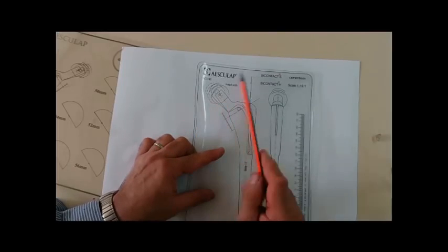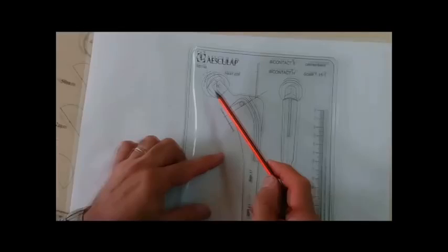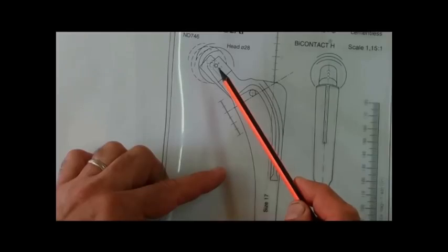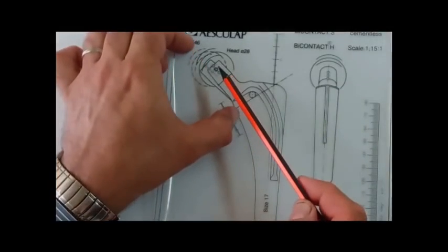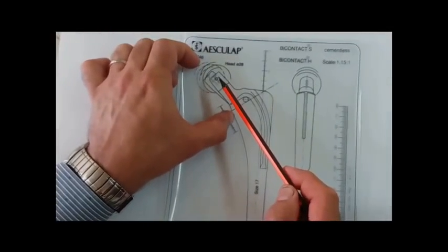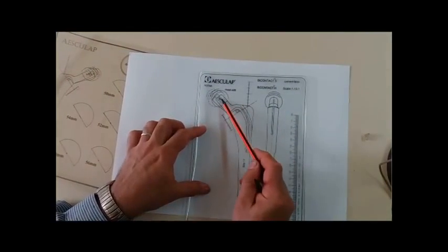This is another issue. The last issue, I think this is clear in the video, is what is called S, M, L. What does this indicate? This indicates the neck length. For example, small; if we go to the medial, this means increasing the neck length. By increasing the neck length, we will increase both the medial offset as well as the vertical offset.